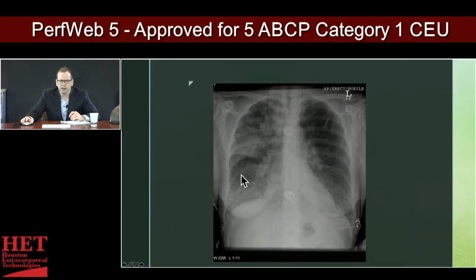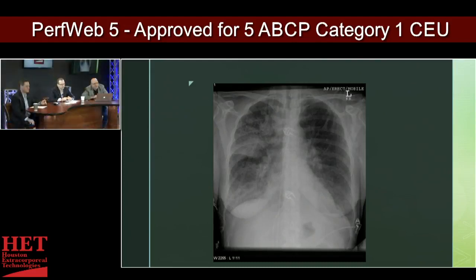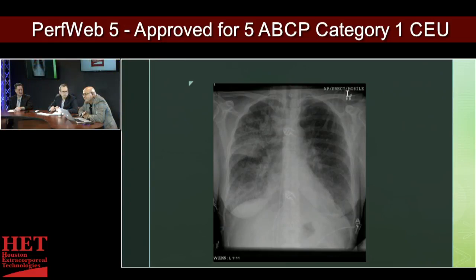Okay. So that's that. And oftentimes with these, since these are all digital images now, you can adjust the contrast a little bit, which we can't here. So if you want to start, now we're on the lung fields. What do you see in the lung fields? I see the right lung is congested, the left lung's not. And it's got several areas, but particularly that one large area in the middle portion of the right lung right there. All I can tell you is it just doesn't look normal.